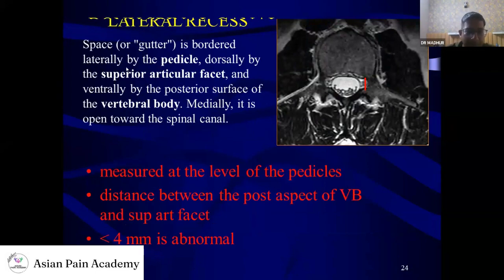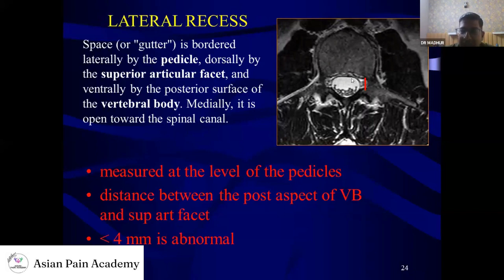Lateral recess is a space or gutter which is bordered laterally by the pedicle, anteriorly by the posterior aspect of vertebral body, posteriorly by the superior articular facet, and medially by the thecal sac. This space which contains traversing nerve root is known as lateral recess. And if it is less than 4 millimeter, we consider it a lateral canal stenosis.